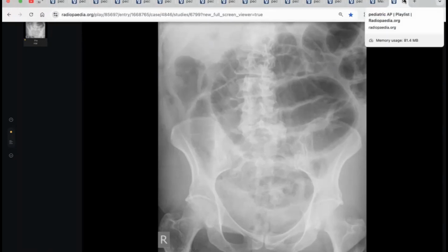Yes, sir. I will urgently convey my finding to the referring physician in ER. If CT can be arranged after resuscitation of the patient, we look at the status of the patient, and after rehydration and all this, CT can be provided to look for the cause. But right now, it's an urgent emergency. I would pick up my phone and convey my finding to the referring physician and ER physician to resuscitate the patient.